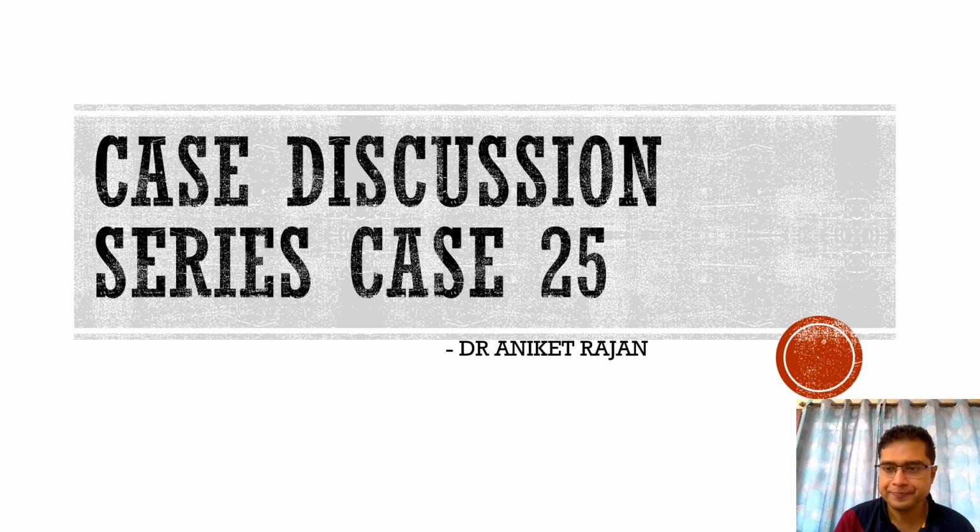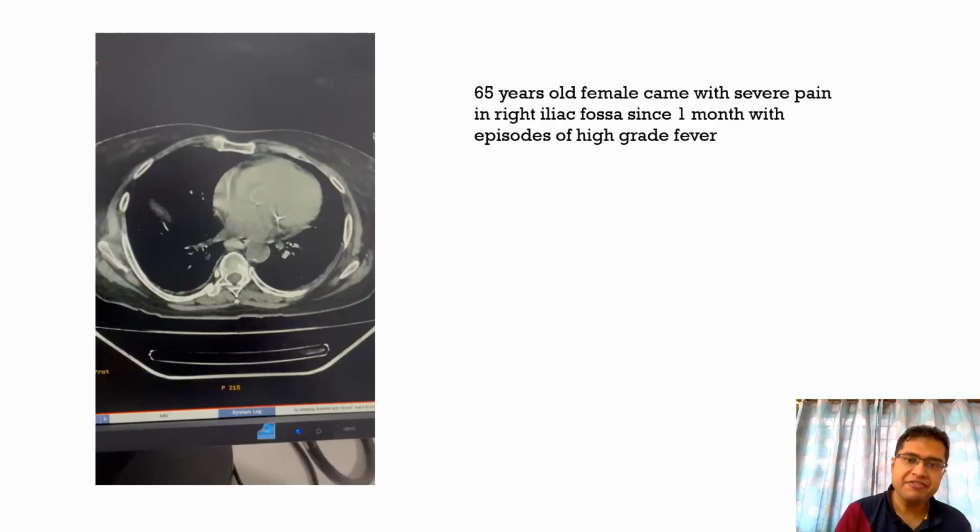We'll be discussing an emergency case today. Here we have a 65-year-old female who came with complaints of severe pain in the right iliac fossa since the past 1 month, with frequent episodes of high-grade fever which have started in the past 10 days. And this is the CT abdomen done for this patient with oral contrast. So these are the plain non-contrast images.